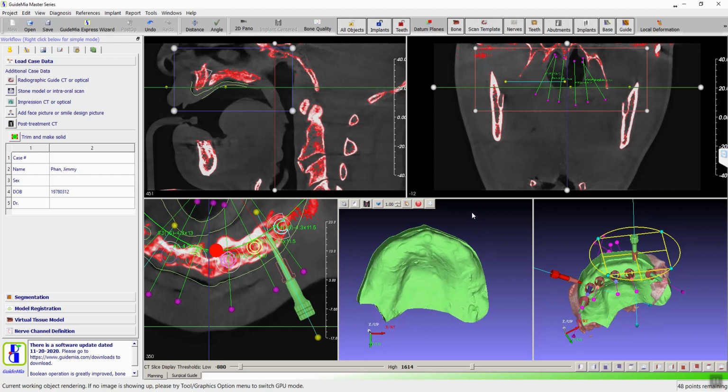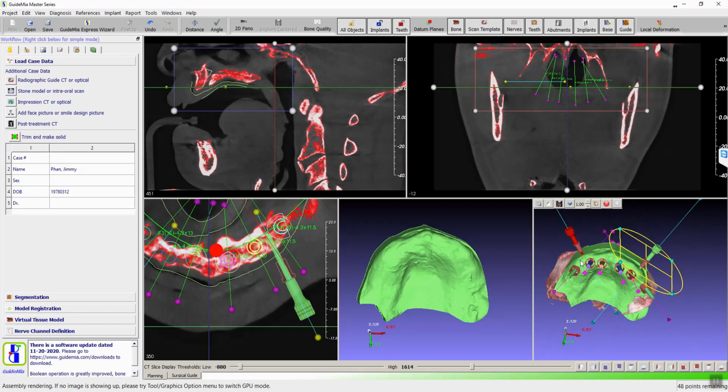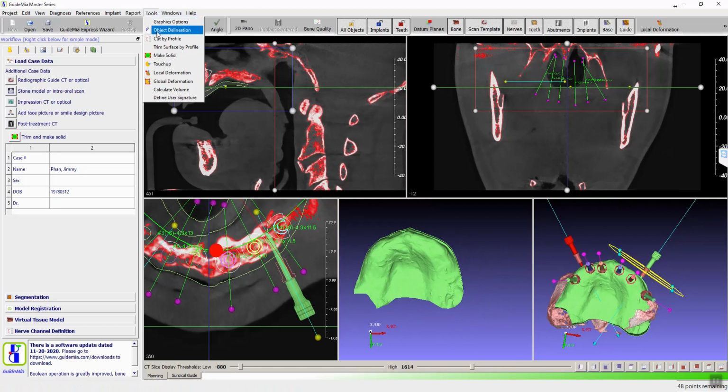Okay, sweet. All right. So we have a tissue model based on the intaglio of the stone model. Yes. Now what I'm going to do, because if you look at this side, my bone model is somewhere here, and what I want is to have the tissue bone guide on the posterior. So first I will trim this piece. It's probably too much here. So I have the tools. I'm going to cut this model.